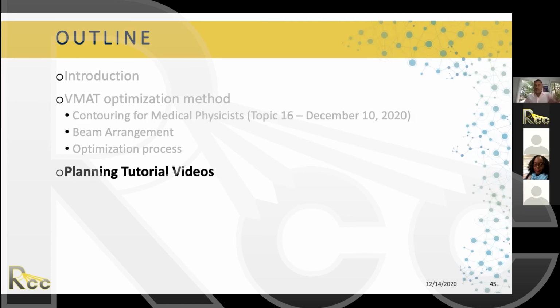Then we said that we can modify them, but that's the logic behind it. The 200 will come with experience. We know that if you follow this method, 200 for the PTV and 100 for the ORs works really well, and then you can move around them.